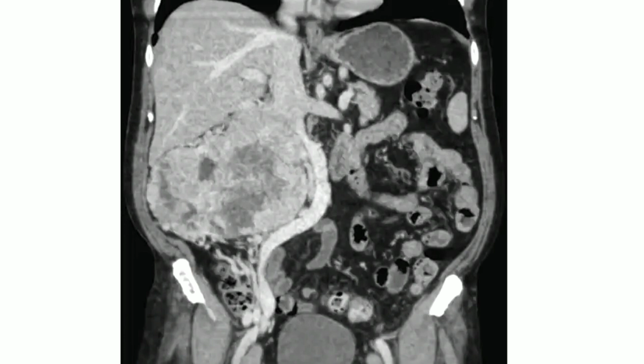An enhancing mass lesion is noted just inferior to the liver, with well circumscribed margin, causing compression on the IVC and vessels. The renal vein is also compressed, causing the secondary varicocele. I cannot appreciate the kidneys clearly as they are not provided in the image.